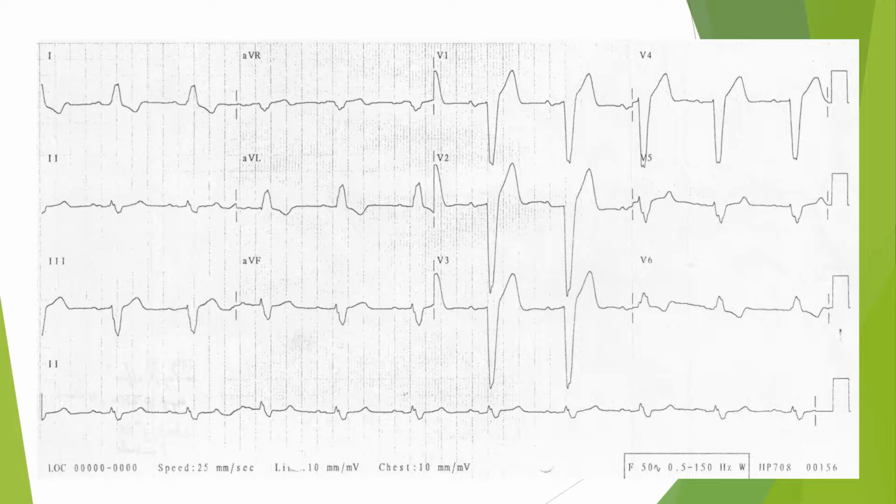What I actually see in practice is that when people see ECGs that look like this, they tend to just discredit it completely, and most oftentimes just treat the patient like they're a standard unstable angina patient rather than actually treating them like an acute infarction. And this happens very much. I've been told many times, oh, it's just a left bundle. Oh, it's a pacer rhythm. You don't need to look any further into it. Treat your patient, not the monitor, which in certain instances I agree with, but in this case, you're going to end up missing some stuff.